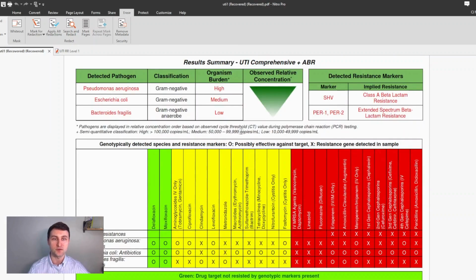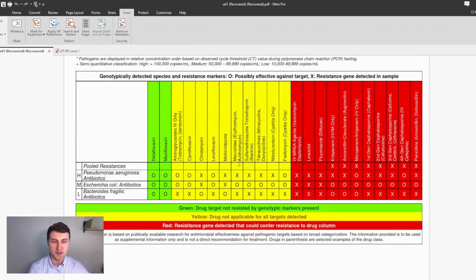So we put all of this information for you from here into this tool right here to help you quickly get to an antibiotic and figure out what treatment option might be best for your patient. And that's really it. All the main information right on page 1 for you.